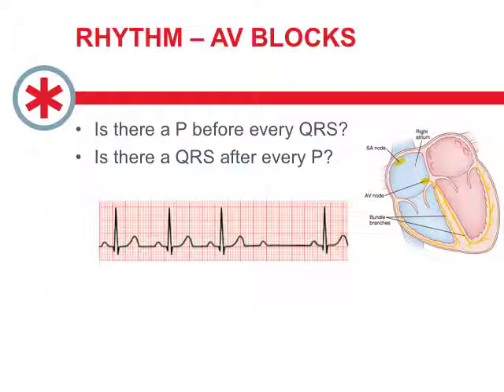So again, take a moment to pause and let me know what you think about this rhythm.